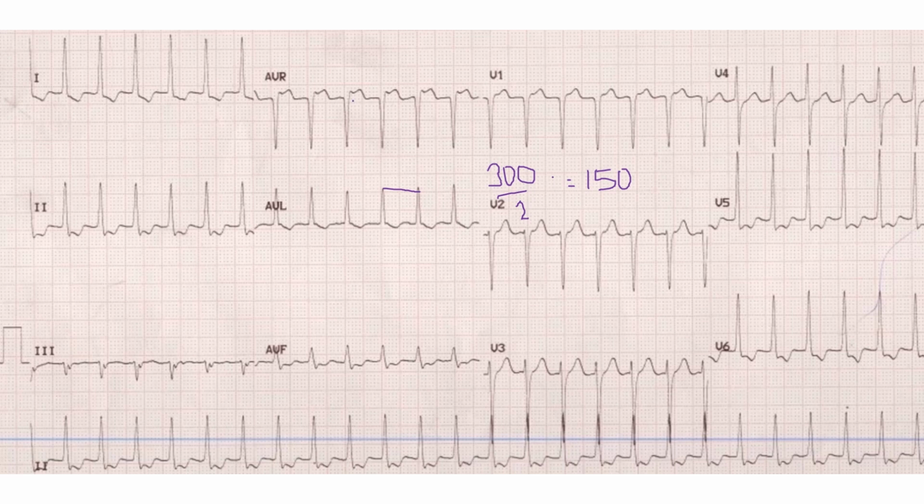So this is a tachycardia. I would say that this is a narrow QRS tachycardia because the QRS is not that wide, and a common form of narrow QRS tachycardia will be AVNRT, that is atrioventricular nodal reentrant tachycardia. It is due to a reentrant circuit in the AV node, downward and upward. The downward circuit will continue upward so that the rate becomes very fast.